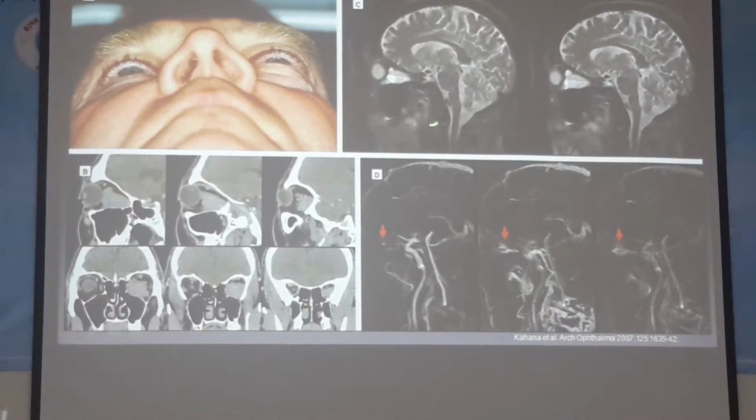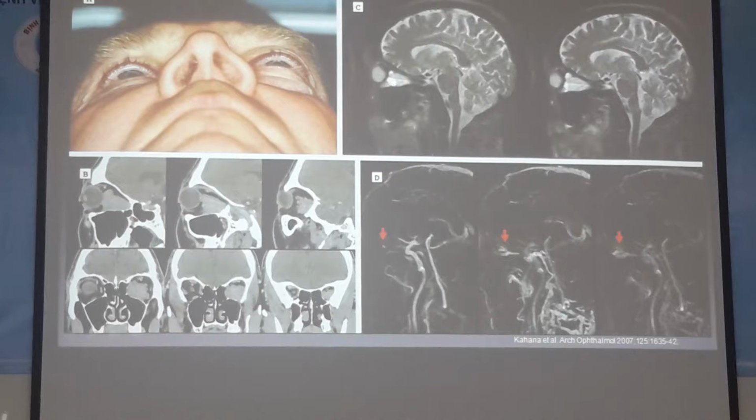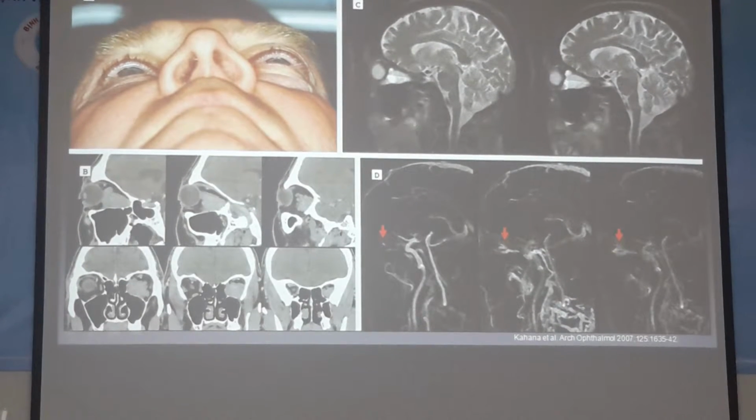And so even if we look with MRI, we start to get some clues. This is a T2-weighted MRI, and we can see that there are some bright areas and some darker areas here, which would suggest that there are blood-fluid type levels present within this.